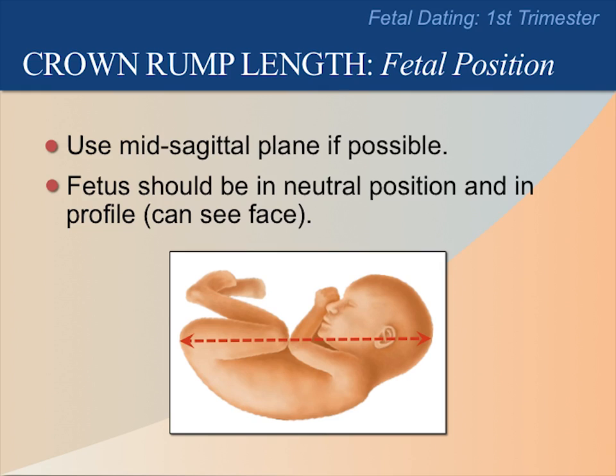Secondly, the fetus must be in profile, meaning you can see the face. If the fetus was turned toward or away from us, you could not see the face. Again, in early pregnancies, it is often not possible to see the face.